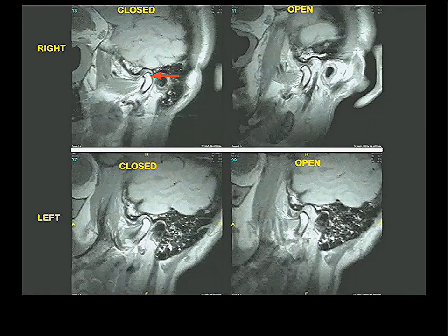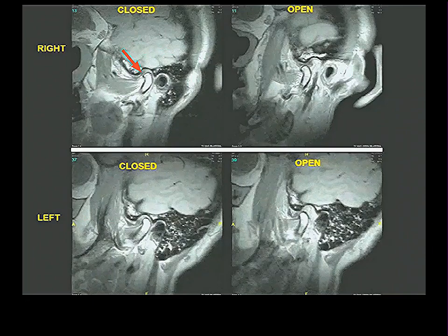Here's the condyle right there. Okay. That's the condyle. Here's the articular eminence right there. Okay, yeah. So then this is posterior and this is anterior? Yeah, so you're absolutely right. This little gray thing here is the posterior band. This little gray thing here is the anterior band. This is normal. Even though it's at 10 o'clock, compared to what we saw before, this is considered normal. Anywhere between 10 and 12. 12 would be if it sat up here, mine sat there.